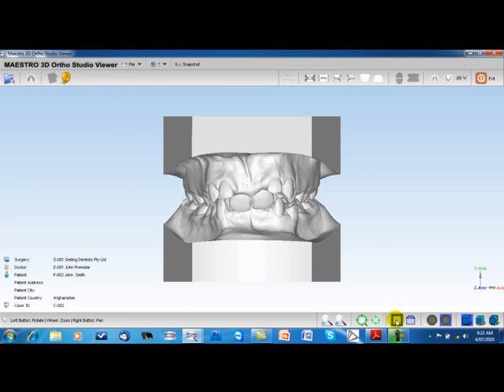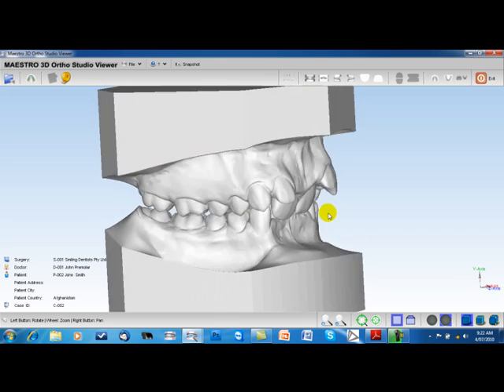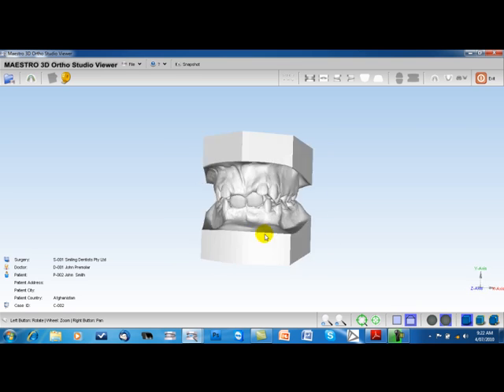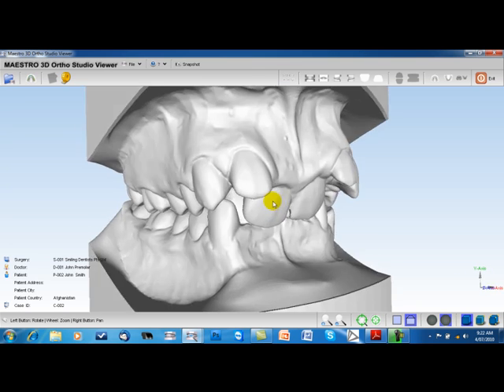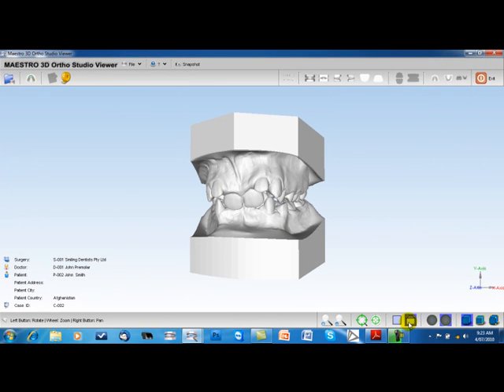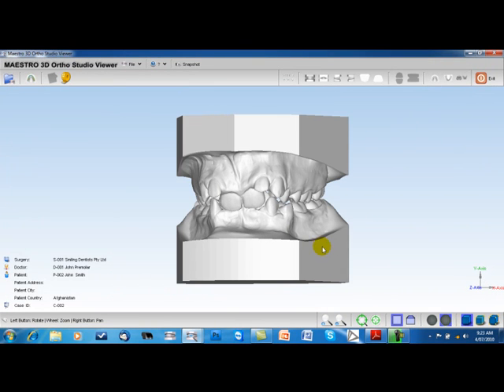Next to that we have what they call orthographic projection, which is what we're in now. It gives you a view in an orthographic projection, and the next one beside that gives it a perspective. I actually don't like this one myself to use every day, but you have the option there.